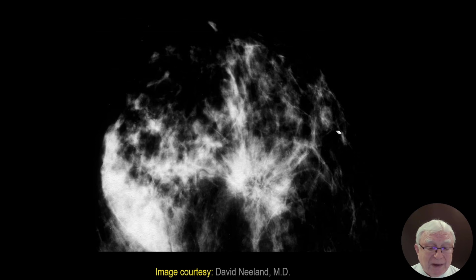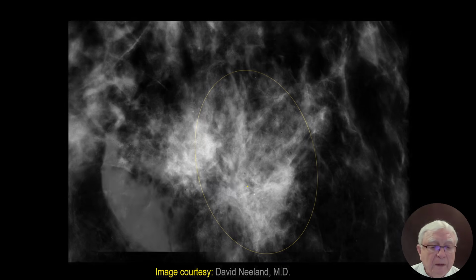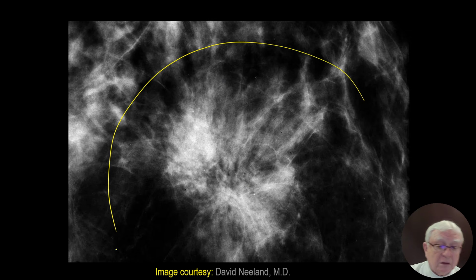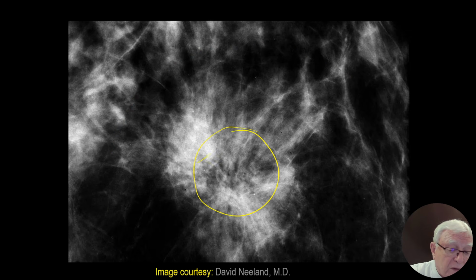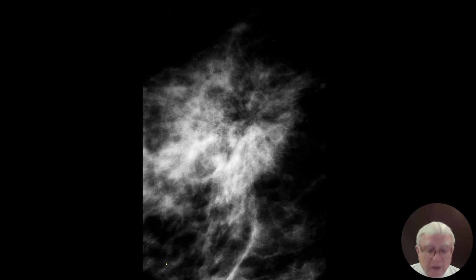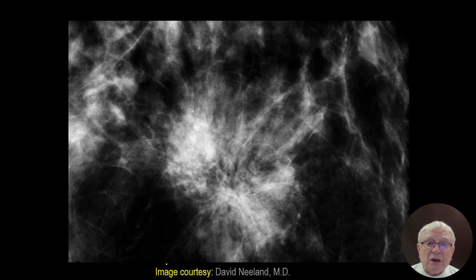This is a huge radial scar my friend David Neeland from Montgomery, Alabama gave me. You know what is striking here again? There is a hole in the bucket. Don't think about cancer immediately. This is a huge radial scar. Very difficult to negotiate with the surgeon to take out so much. Sure, your responsibility. You are not allowed to take out this much. This much has to go out. You see how much it changes from projection to projection?